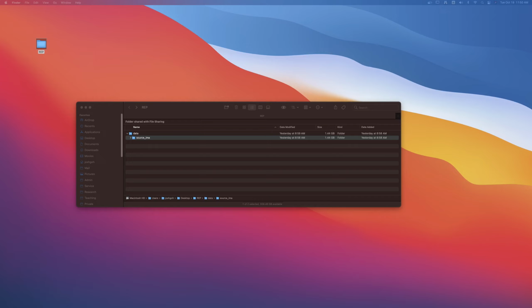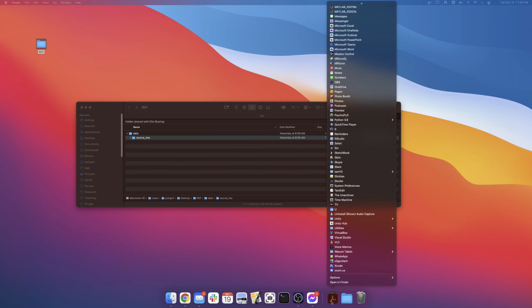All right. So to do that, the software that I'm going to use is MRIcroGL, and I've installed that. MRIcroGL is like the advanced version of MRIcron. MRIcron also has the Dicom to Nifti conversion, but the more recent package is MRIcroGL. If you haven't installed that, just go ahead and Google that and install the latest MRIcroGL, and it will come with the dcm2niix Dicom to Nifti conversion software as well.